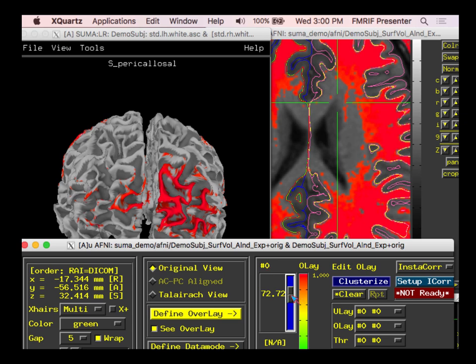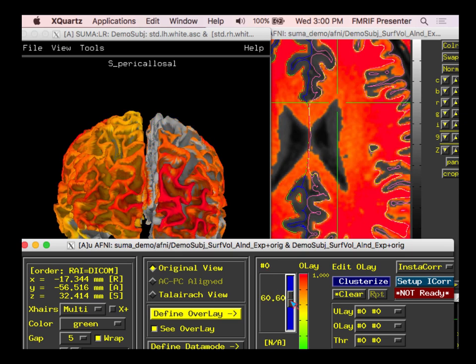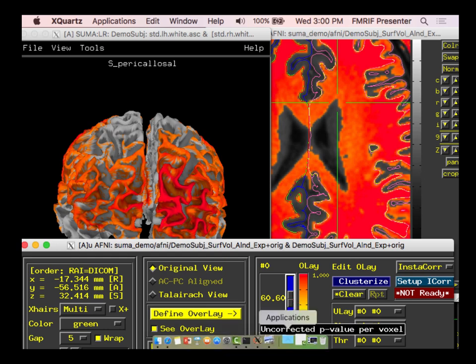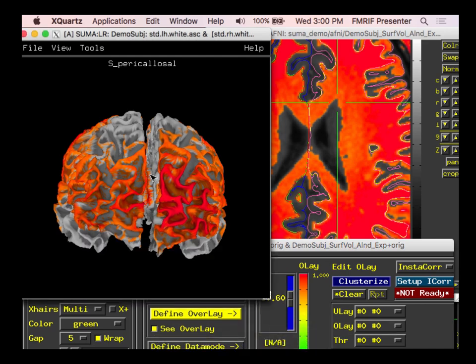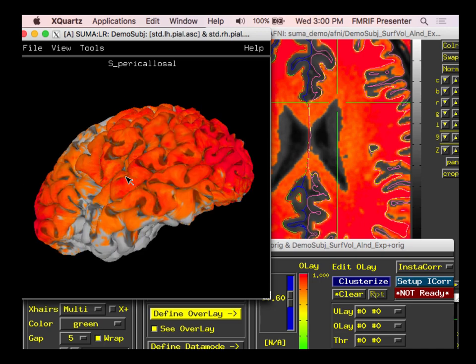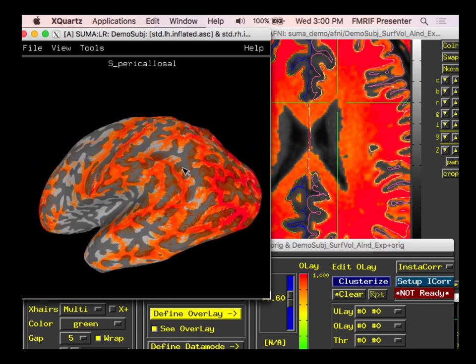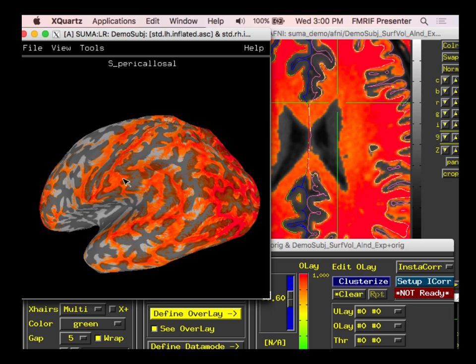And so this can be really useful because, for example, with what Bob was showing with statistical information, I can look at it in a slice and okay, but it's a little hard for me to see, is this the whole visual cortex, and I'd have to go through lots of different slices. Well, I can just project all of that and the clusters and this and that here, and I can play around with how it's viewed, so how it's most meaningful to me. So now I can see, okay, it's really going through these sulci and gyri, etc.